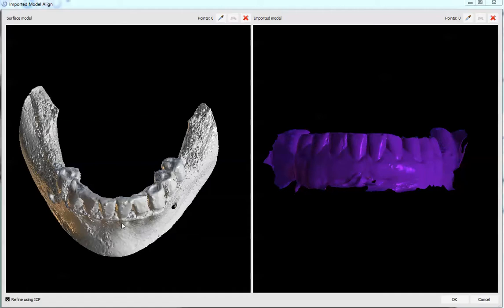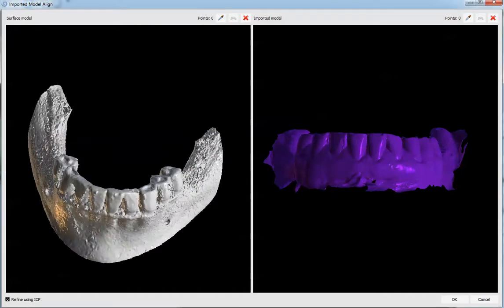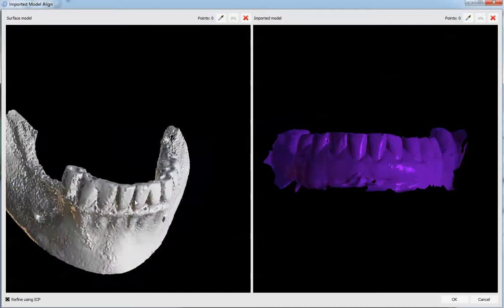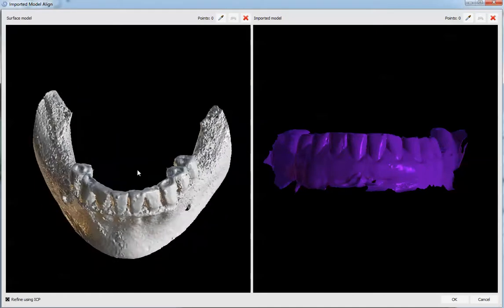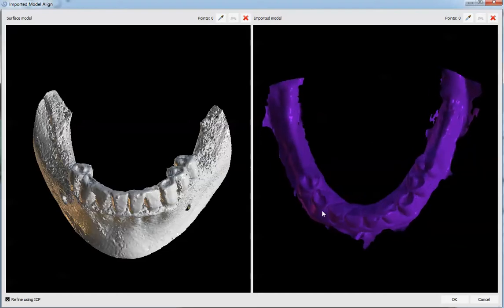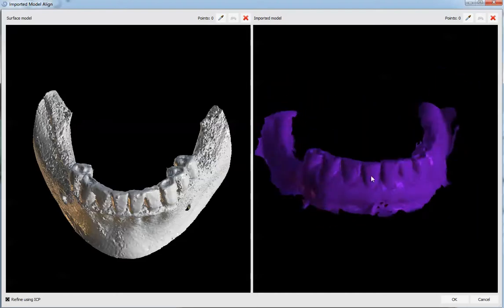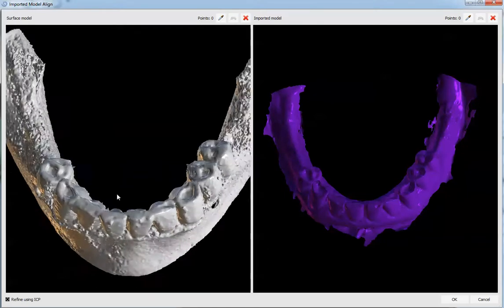So what I've done is I'm going to start with this case. We're going to place some implants on the lower mandible and on the maxilla and in all posterior quadrants. When I imported the DICOM data, I saved it, and then I imported the STL of the patient's teeth that we scanned today. The computer had a hard time meshing them together.